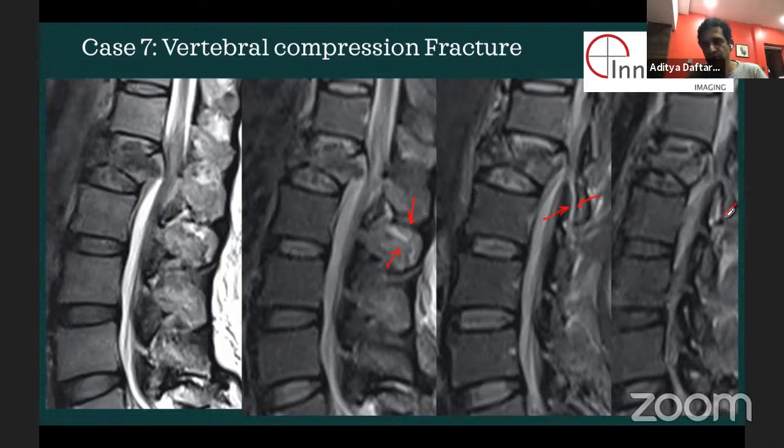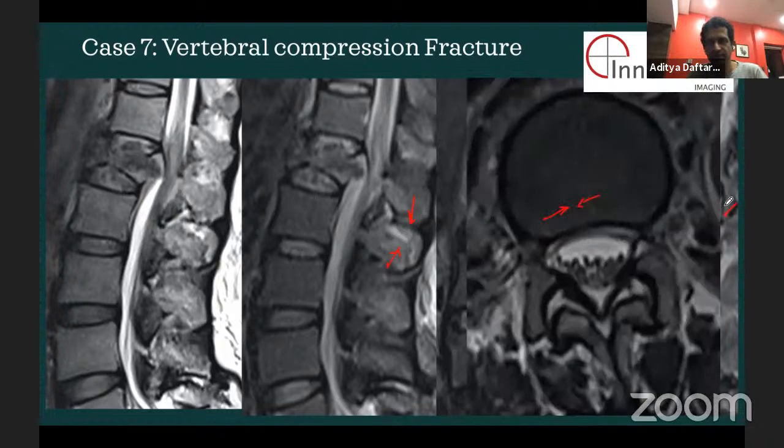And when you see this facet joint widening along with all of this stuff, here's the axial image, and you can see again this facet joint widening. The idea really here is that this is a hyperflexion or a chance injury, and you have posterior interspinous ligament involvement as well as vertebral compression. So this is a hyperflexion injury, which is like a chance fracture.